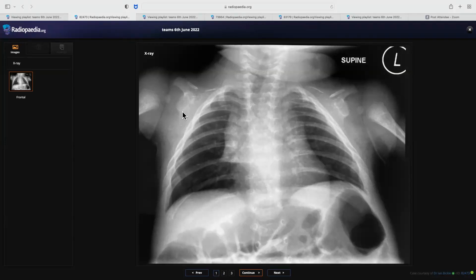I think you were more focused, you got focused on this thymus, so maybe that was misleading. So this is a normal thymus. This is not a pneumomediastinum. Yes, this is normal. I missed this one. So this is absent clavicle.